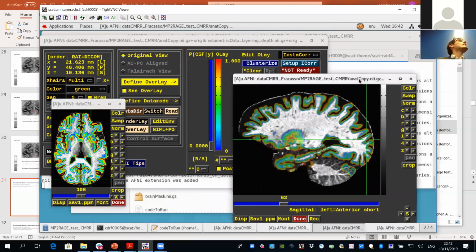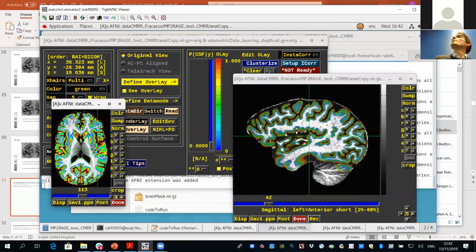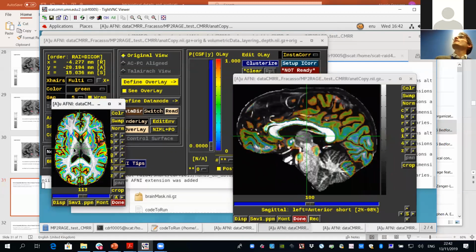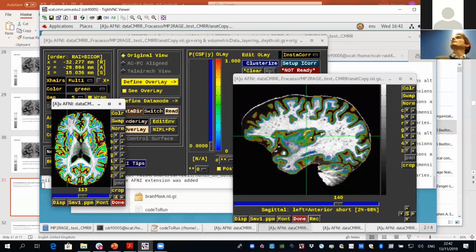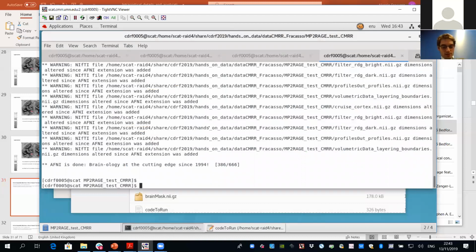Is that like caudate nucleus getting... Oh, probably. Probably there were some issues here. Yes, yes, yes. But okay, this is not bad. Do we like this? Yes. Now let's try to see what I said before, right? AFNI surface. Now let me interpolate it. Just copy the values.